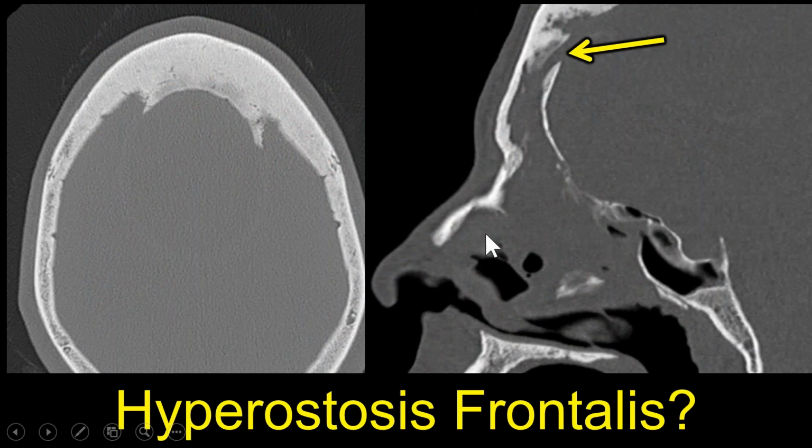Now, here's another case we looked at. So we did a CT on this patient, and he had what the resident thought was hyperostotic changes. So these are CT images, and these are bone windows. So we're looking at the bones, and we see the very high density and thickening of the bone anteriorly. But on the sagittal bone algorithm CT, you could see it looked like there was a little hole extending up superiorly from the frontal sinus. So we wanted to evaluate that better.